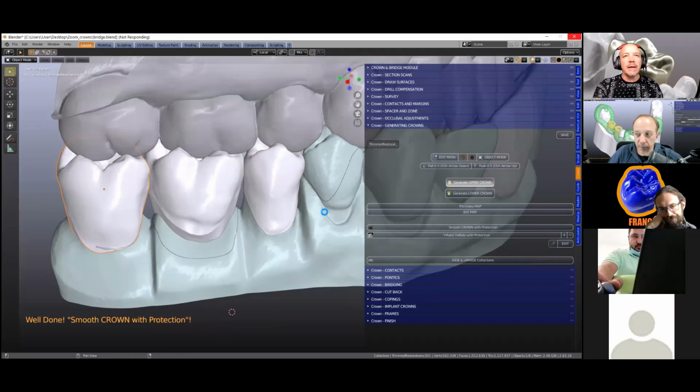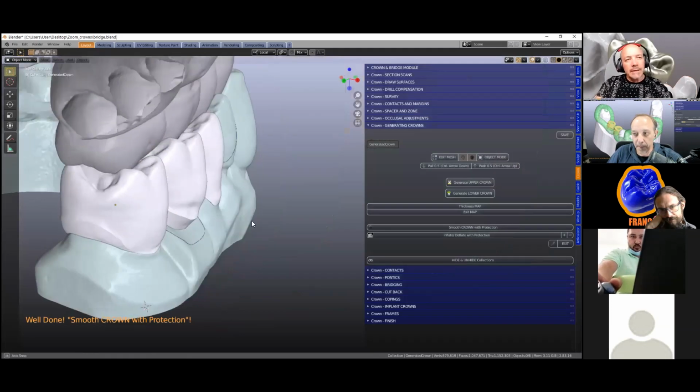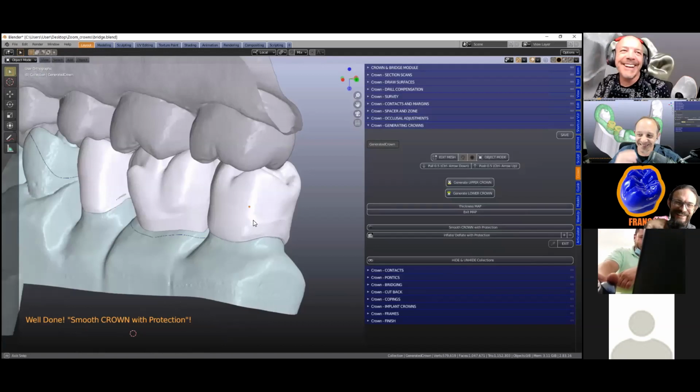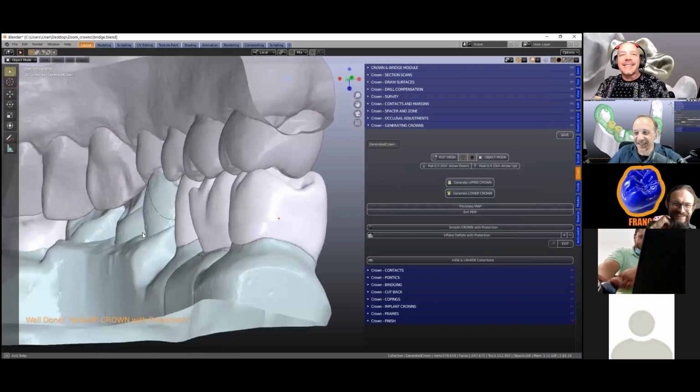Essentially what that does is it takes the tooth library and merges it together with the inside of our cut, our surface that we've initially created. All right, perfect. It's like magic. Every time I see that, I think, whoa. All right, so that's all good.